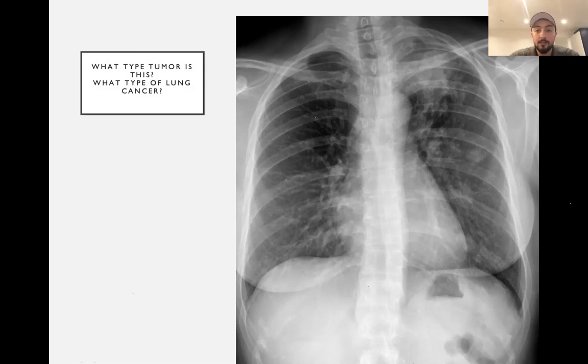And also they will ask what type of lung cancer this is. Now, if you want to get excellent in your OSCE, which I'm sure everyone would want, you have to make sure you answer this correctly. If you go through the A, B, C, D, E, the quality, the date, literally everything else, and not tell them what type of lung cancer it is, you will not get excellent. You need to tell them the type of lung cancer that is. Anyone wants to have a go? Anyone that wants to have an excellent on their X-ray OSCE?